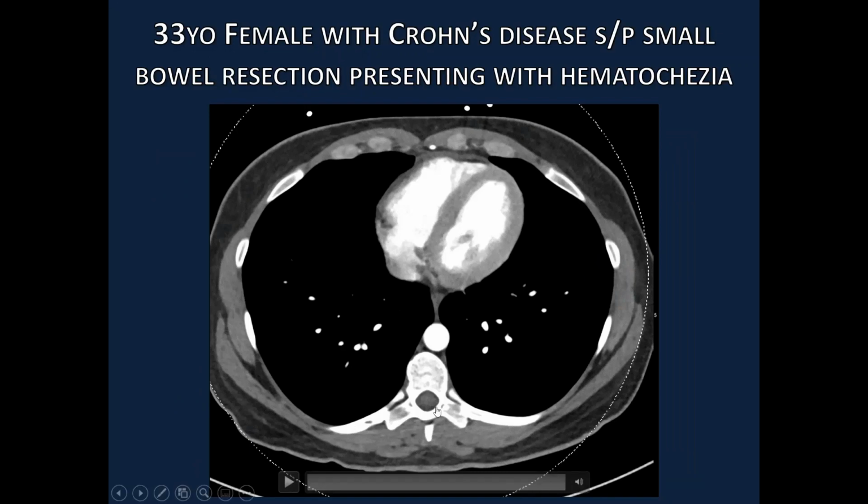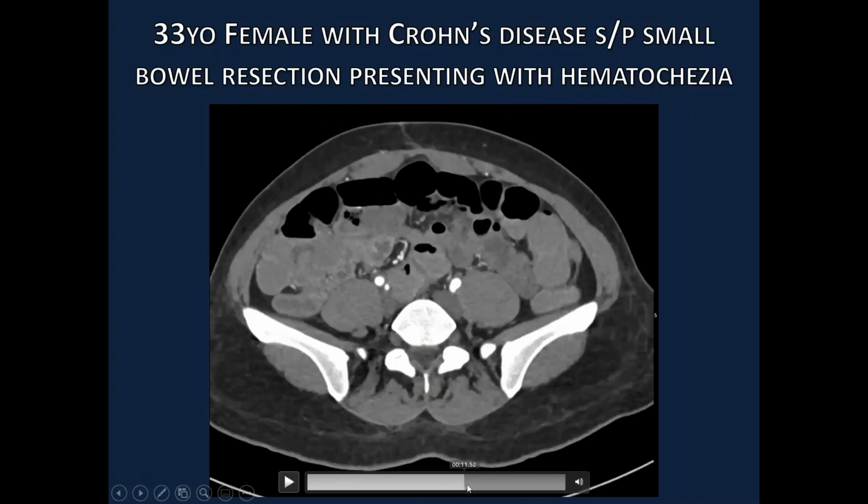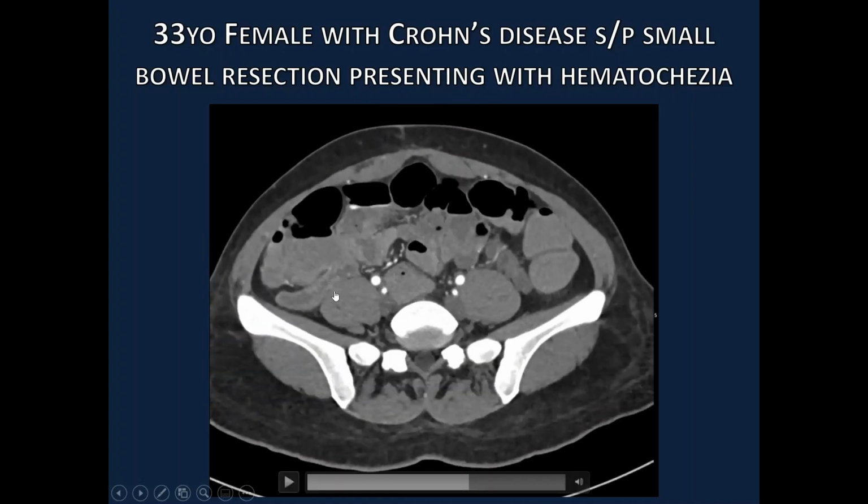Here's an example of a GI bleed. This is a patient with Crohn's disease, and on the arterial phase, you can see that the bowel is nicely distended with this VoLumen contrast, low density, but we see this area of high density layering on top within one of the small bowel loops. And this was not present on the non-contrast phase, and so we know it's truly IV contrast that is extravasated into the bowel.